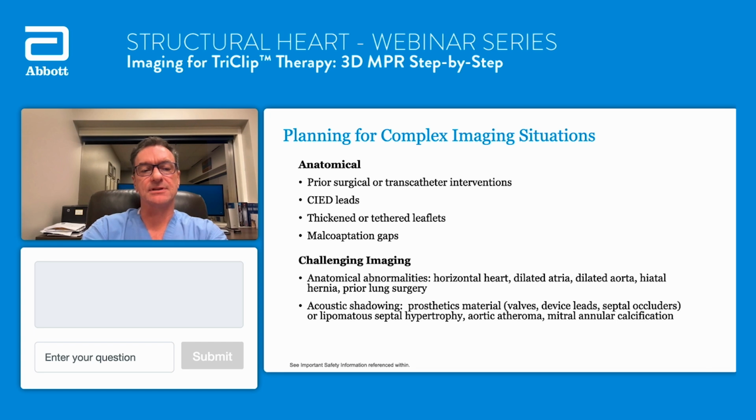So planning for these complex imaging situations, we have the anatomical considerations of prior surgical or transcatheter interventions, CIED leads, thickened and tethered leaflets, malcoaptation gaps. The challenging imaging, where sometimes anatomic abnormalities, a horizontal heart, dilated aorta, dilated atria alone. One of the common ones, which can be very challenging, is a hiatal hernia or even prior lung surgery. So this review of the patient chart and the patient history can be very important in predicting the imaging challenges. And then the acoustic shadows from almost any prosthetic device that's in the heart, lipomatous septum, or even atheroma or annular calcification of the mitral valve.